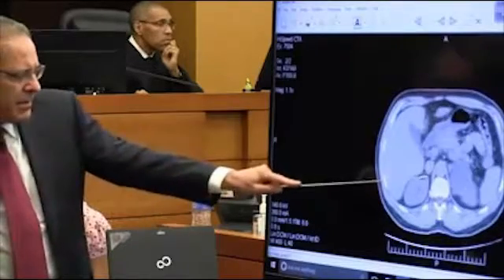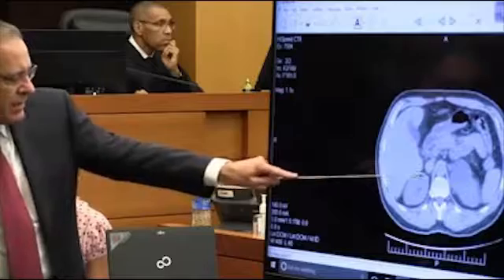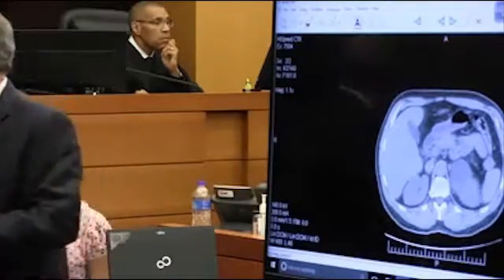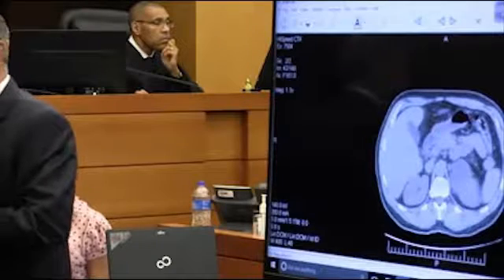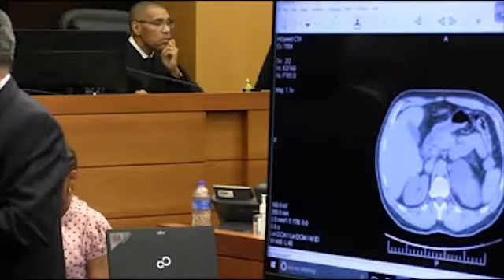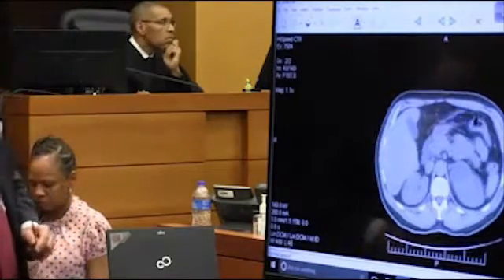See how it kind of comes up? That's a contour issue. You see it kind of goes and then that's a normal variant. Is that a suspected nodule? No, it's not. Is that a finding that requires a follow-up contrast CT scan? It doesn't.